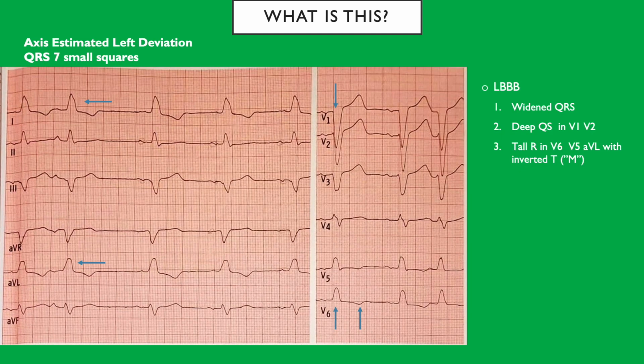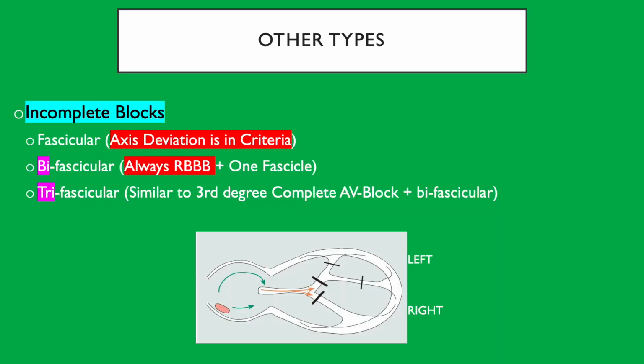It's a bit difficult because there is no notch, but this should be the left one, okay? So you have the M here, the negative T is there. Look for the negative T's. Okay, there are some other types. You can read for them by yourself.